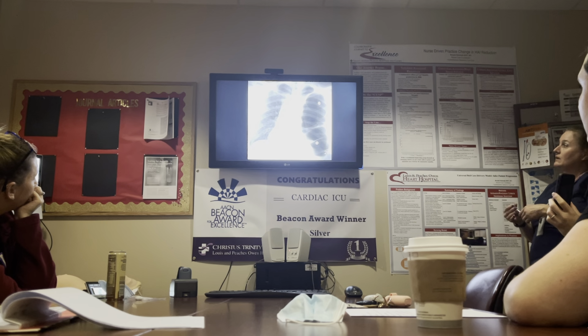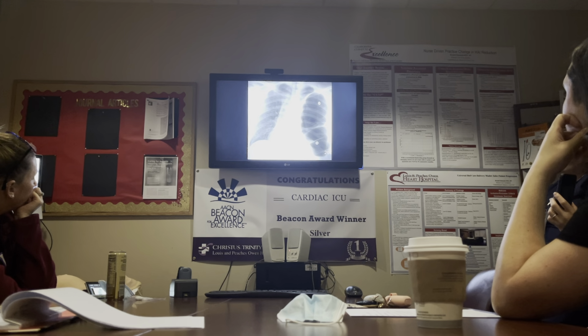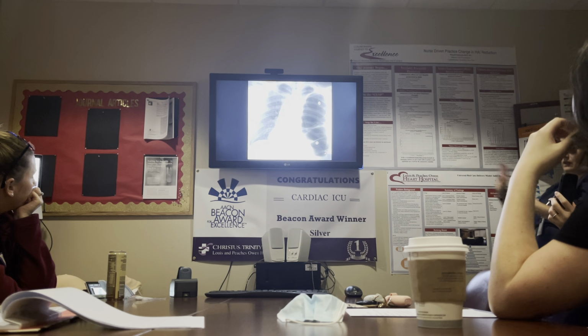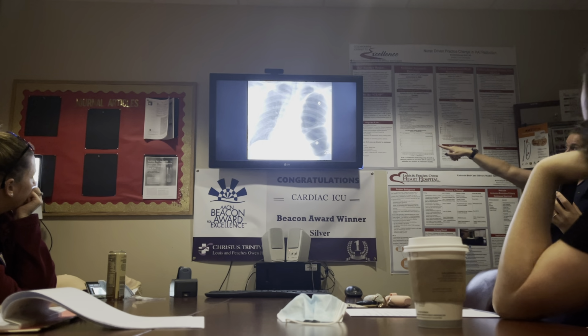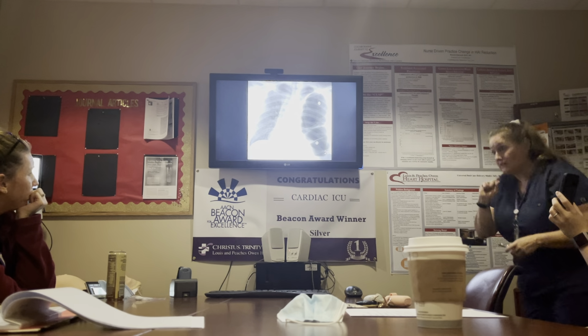So it's a good film. It's fairly centered. You're seeing a little bit of shift of the cardiac silhouette to the right, which is the left-hand side when you're facing the film. What's over here? Nothing. Another collapsed lung? No, it's not a collapsed lung.